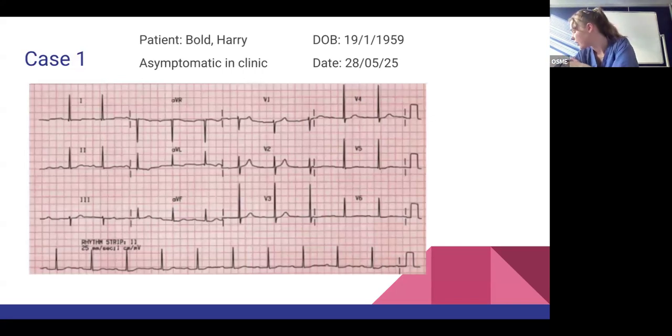So I'm going to now give you some time to have a look at this using the structure that we went through before. And start having to think about how you would describe this. So everything from patient details to what the waveforms say, everything like that. Just a minute to think about what you're seeing.